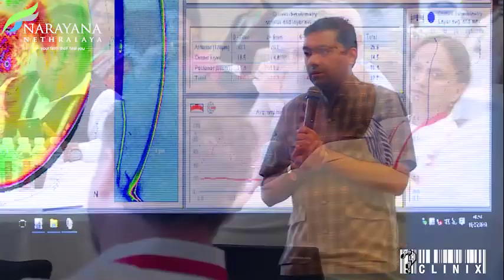Yeah, and the one thing I think is even more confusing is how to determine progression after cross-linking. On the new display, when you indicate you've treated a patient, all those confidence intervals go away. So I don't know how to determine progression after cross-linking. Maybe Theo does. I have no idea how to do that. And that's it. Any questions?